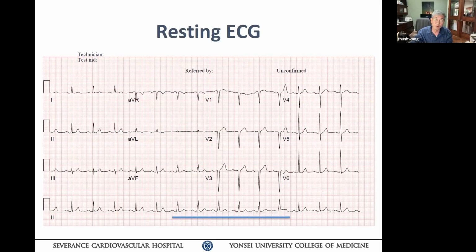If you look at the very first beats, you see one, two, three, four, five beats, and at the fifth beat you lose a small Q. You see that? There's a Q, then no Q, it gets wider, and then what happened? It comes back again. So that really bothers me.